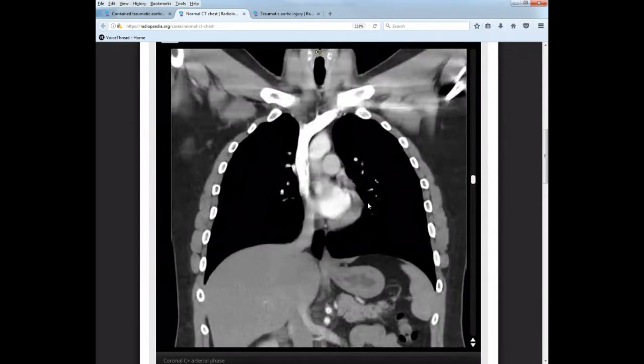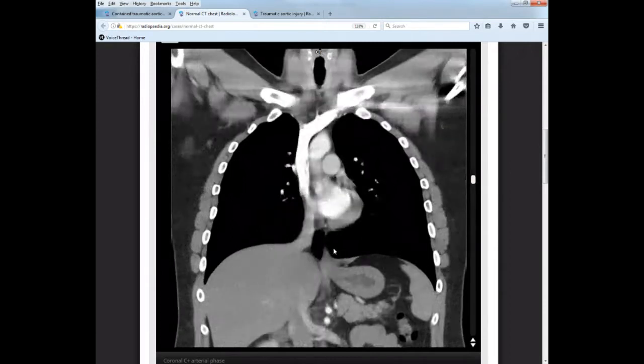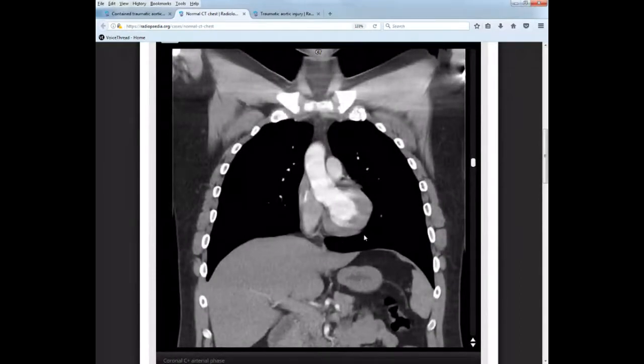The other thing I want to point out with the left lung, you see this notch right here, allows for the heart to nestle right in there, snug in that notch of the lung. That's your cardiac notch of the lung. And then just inferior to the cardiac notch, this little thing that looks like a tongue actually, is the lingula of the left lung. Okay, very easy to see on a coronal slice when there isn't traumatic injury. When we switch over to the traumatic ones, you're going to see how there's going to be fluid in here, and we're going to have shifts because of the fluid and pneumothoraces and that kind of stuff. It's not quite going to look the same.